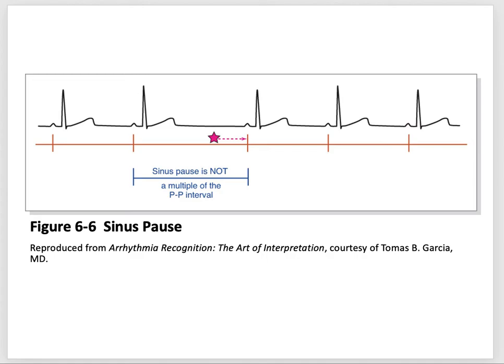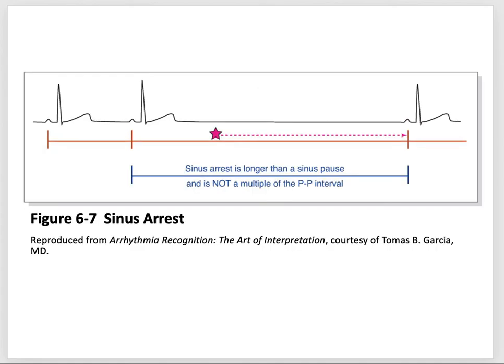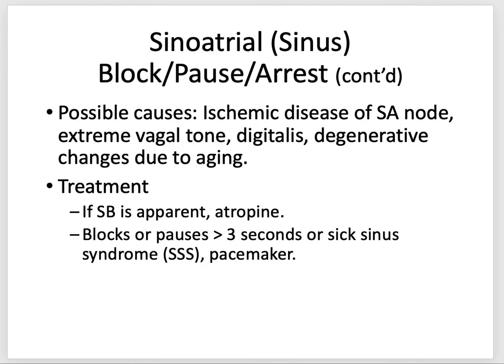The R to R intervals are, as you see, very delayed. Here in this photo, we have what we call sinus arrest. Sinus arrest is longer than the sinus pause. So again, we have kind of this big delay in contractions.